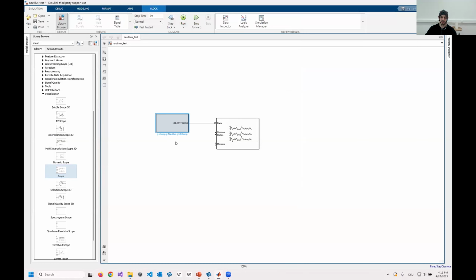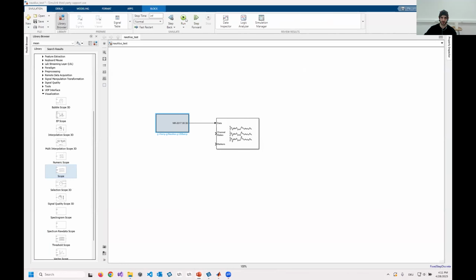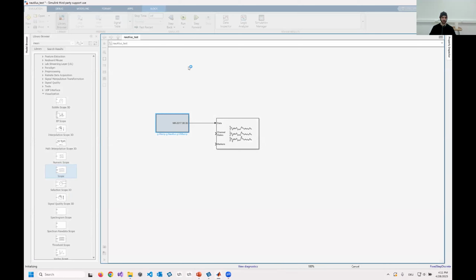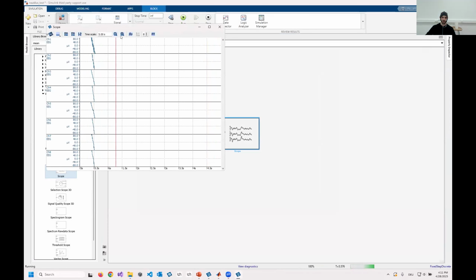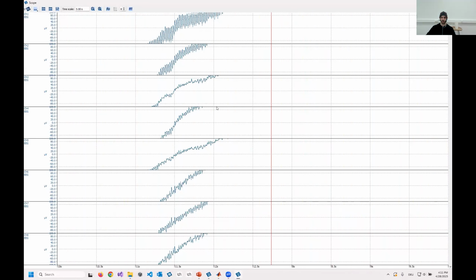And that's basically it for the first task that I've defined, creating a real-time data acquisition and display. It's very simple. It just took a couple of minutes. And now you should already be seeing data floating in. We still have an offset, so I'll stop talking quickly.